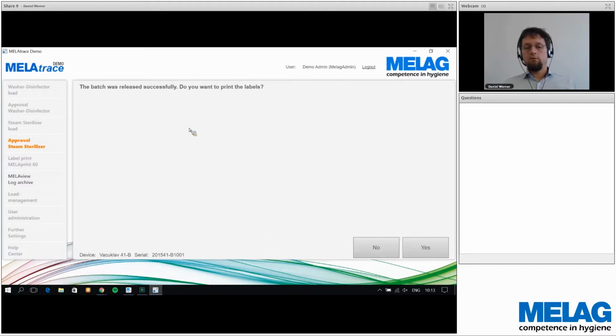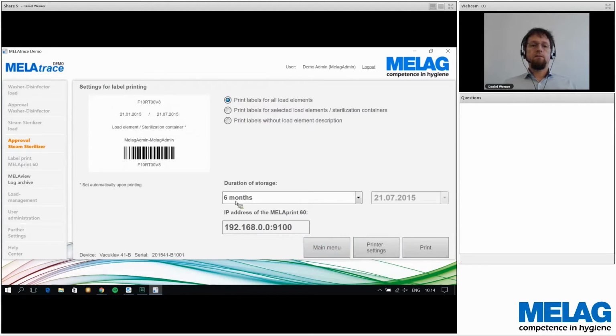And I see here the overview for my label. And I see exactly the same description here, the cryptical code. And this is exactly in that barcode. That number here is in the barcode.